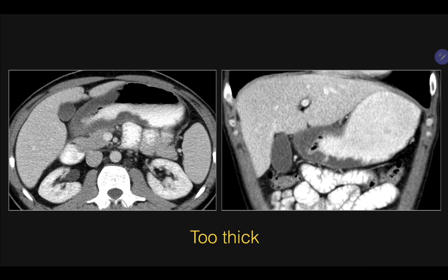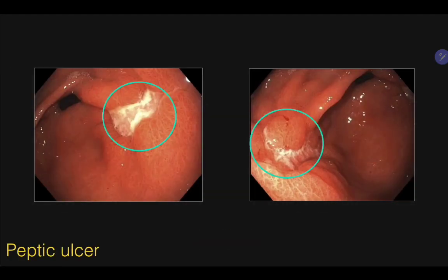For our first case, the gastric antrum is too thick, and especially stands out compared to the rest of the stomach. But is it cancer? Well, notice how it's relatively low in attenuation, indicating that edema and inflammation are primarily the culprit for increased thickness. And indeed, this patient was referred to gastroenterology, where they found several superficial ulcers in the antrum on endoscopy.